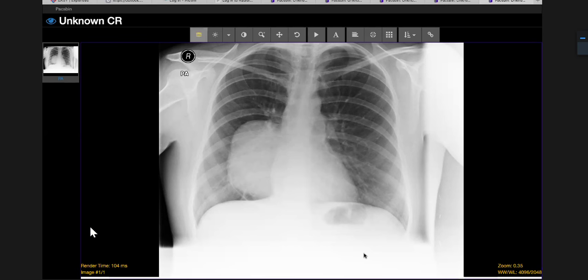Then I want you to rattle off three differentials, which by the time you come around to the exam, you won't even have to think about. Your first differential was neurogenic lesion, which I like. I like that as a first differential. What kind of lesions are you thinking of specifically?